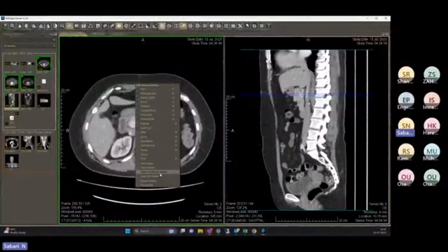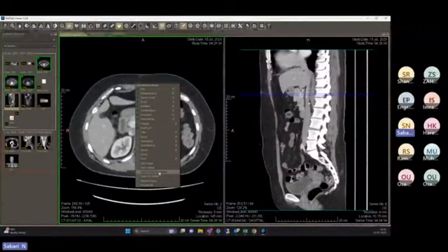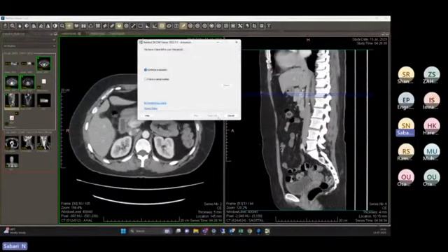And open in external viewer. As I said yesterday, when Faisal asked the question, my radiologists are very familiar with using the Radiant viewer and all those things. It's not only for Radiant viewer. You can use any viewer. When you click on open in external viewer, if that viewer is installed on your PC, automatically the viewer will open and the images will get displayed here.